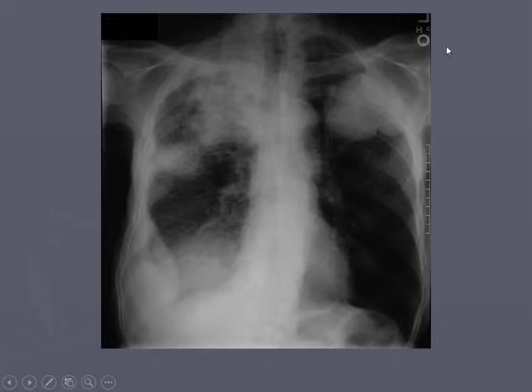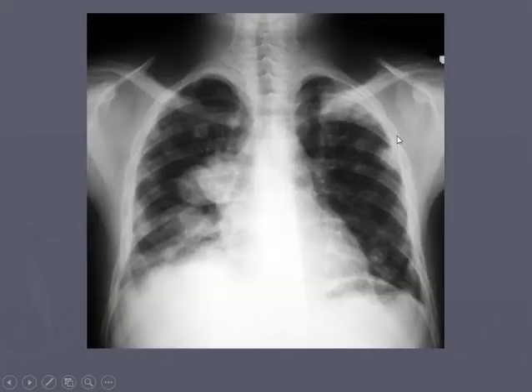F for fields, we have our left marker, and then for everything else, of course, it's very obvious. Lots of tumors, just huge tumors all over the place. Again, you can see they're mostly in the apices. You can see how this is more discrete. This is fuzzier. He probably has some post-obstructive pneumonias here with some masses. Here's some more examples of masses that we're seeing right there, and these small little ones all over the place. Again, there.